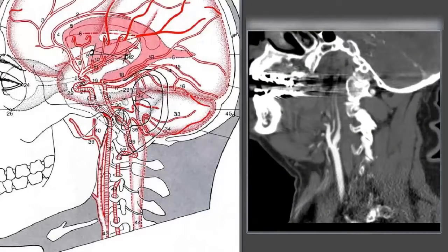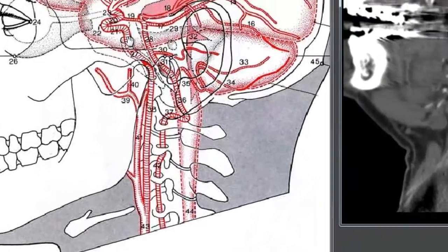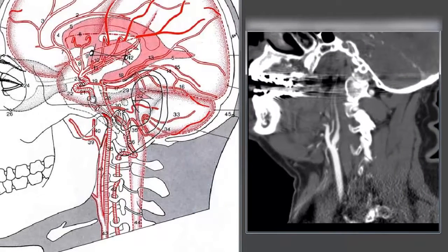So now we're looking down in the neck portion of the same patient's CT angiogram, and this is a thick MIP reconstruction through the left internal carotid artery's origin in the neck. And so once again, to review the anatomy, we're looking at the common carotid artery and the carotid bifurcation in the neck. So that corresponds on the diagram here, common carotid artery, the bifurcation into the branching external here, and the non-branching internal carotid artery all the way up through the skull base.